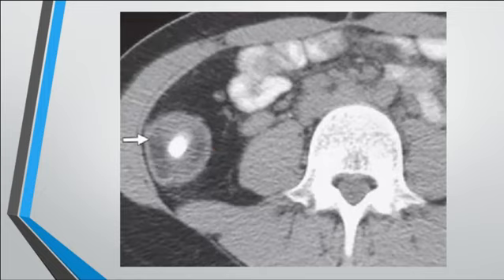What's this? You can see this is colon, and this is contrast in the lumen. And you can see the submucosa is thick and hypodense. It's decreased density. Due to what? Due to fatty deposition. So this is called fatty halo. It is usually seen in patients with long-standing ulcerative colitis. You can see an increased amount of fat deposited in the submucosal layer of the bowel.